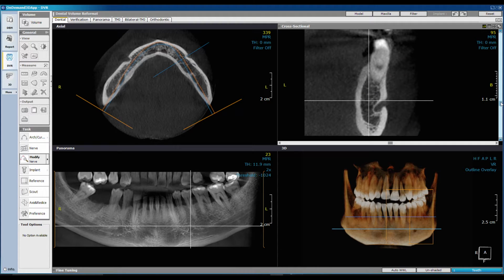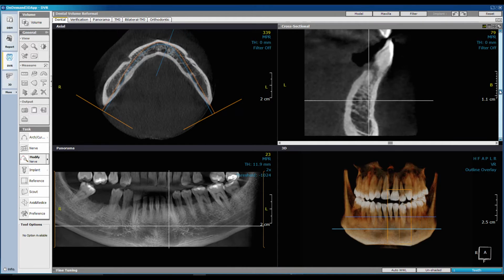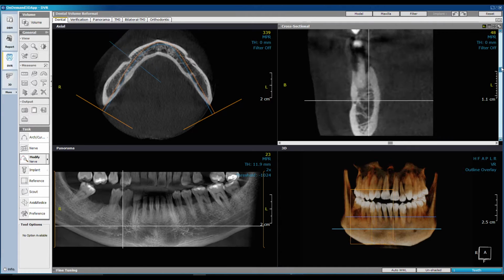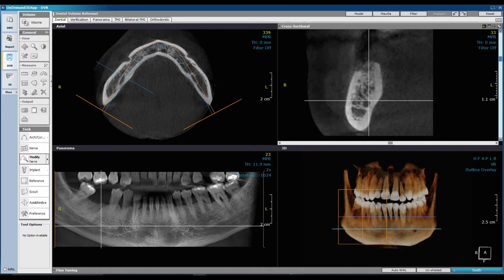We go to the right hand side border of the cross-sectional workspace and press and hold this bar, and we move it up. So you will find here on your left hand side at the bottom the cross-sectional line is moving, and here is adjusted to the center of the area of interest.